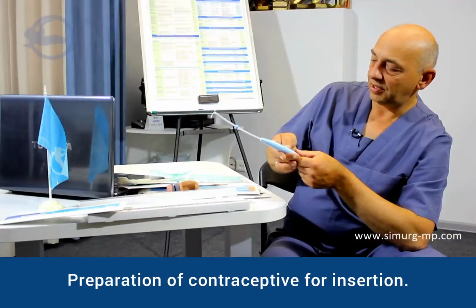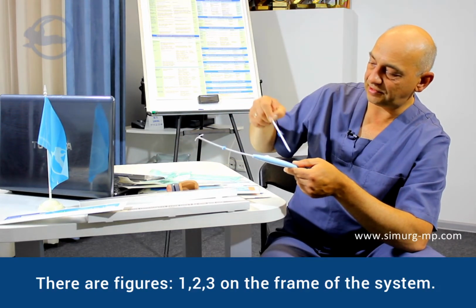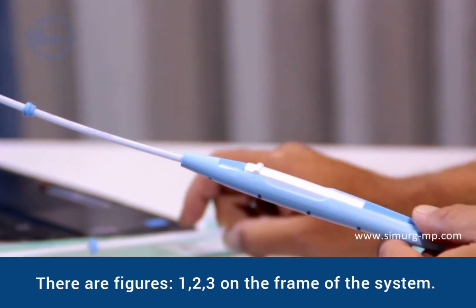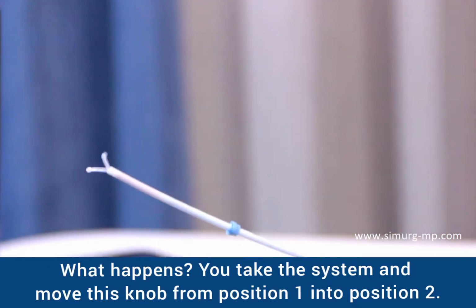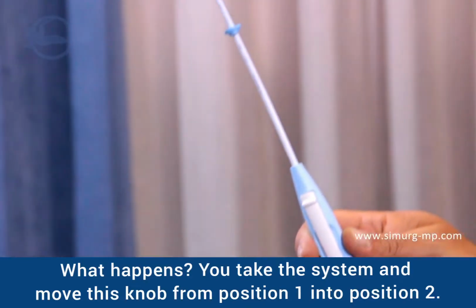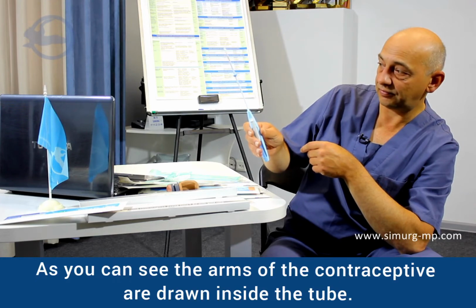Preparation of the contraceptive for insertion. There are figures 1, 2, 3 on the frame of the system. What happens? You take the system and move this knob from position 1 into position 2. As you can see, the arms of the contraceptive are drawn inside the tube.